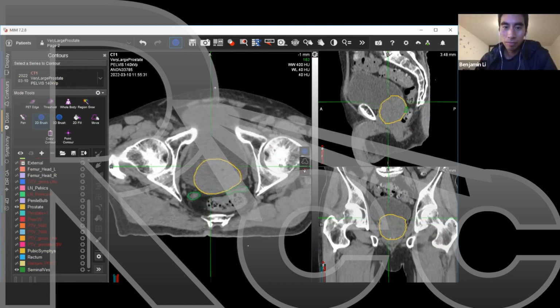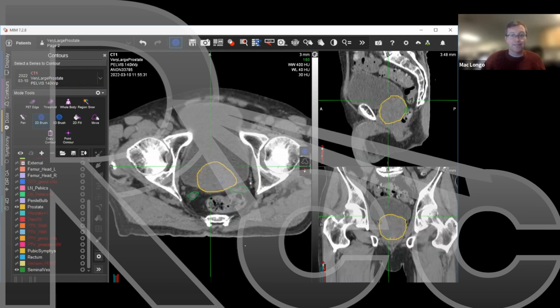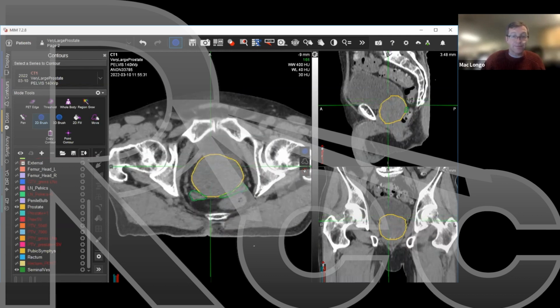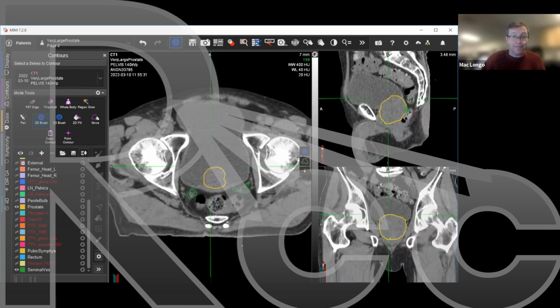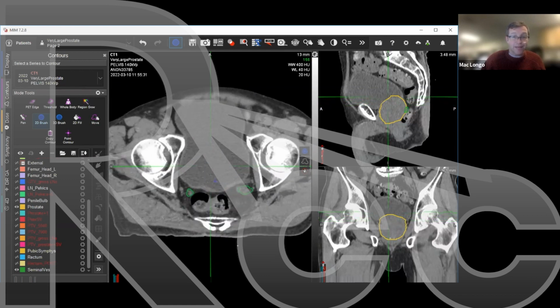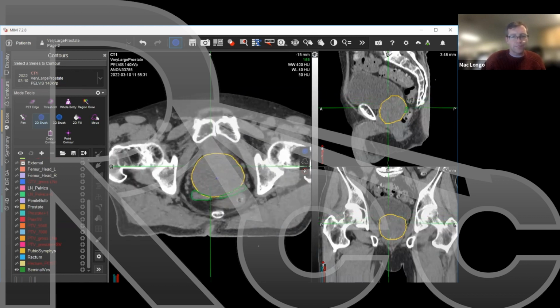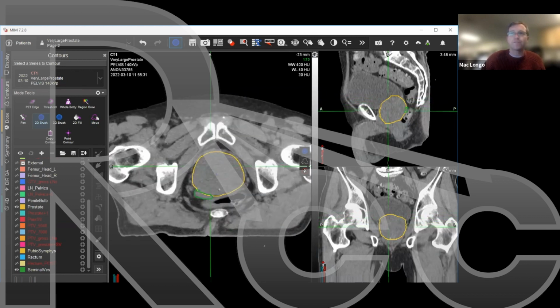It has effaced the bladder neck, so we can't see the bladder neck. It's actually really compressing the seminal vesicles too. And it extends a good bit up into the bladder. I think this gentleman's prostate was 150 grams.